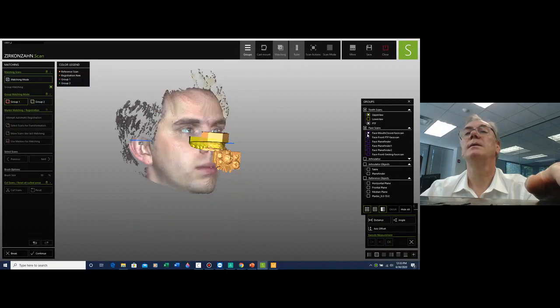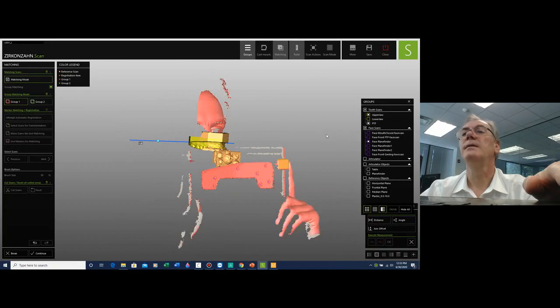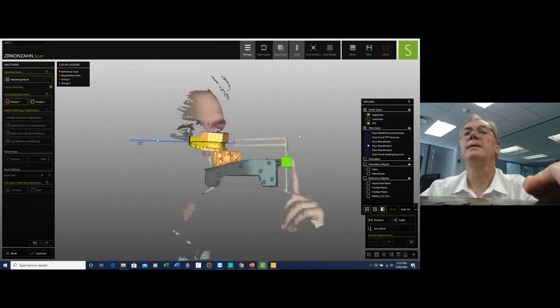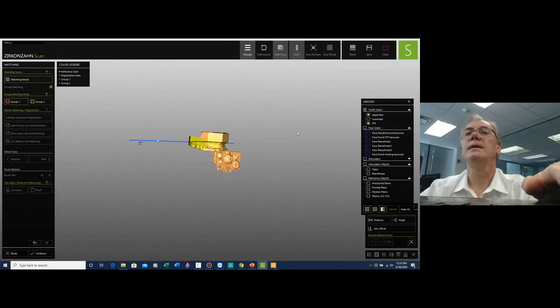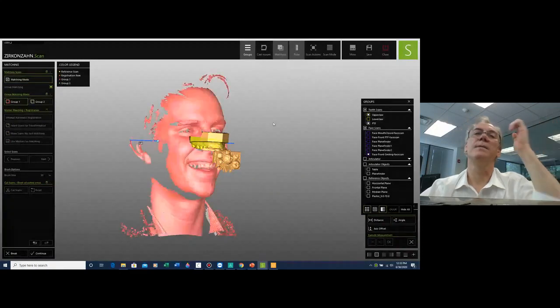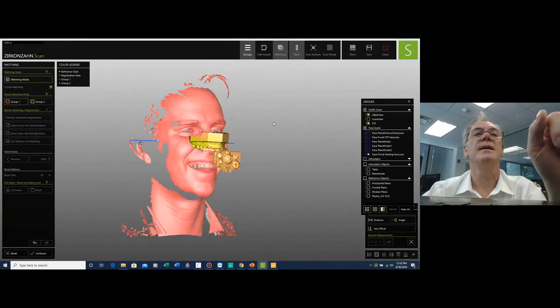So that's 1, 2, 3, 4, 5, and 6. These are all the elements I want to move together in that exact position.